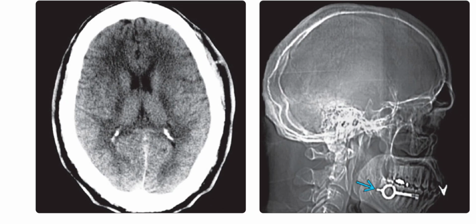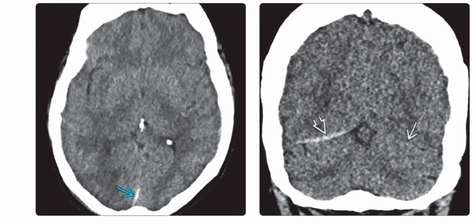This case illustrates the importance of looking at the scout view in every patient, especially those which are being imaged for trauma. Left is the axial non-enhanced CT scan in a 64-year-old female with a ground level fall, and it shows only a small linear hyperdensity adjacent to the falx cerebri and torcular herophili. The scan was initially considered normal. Right is the coronal non-enhanced CT scan in the same patient. It was reformatted from the axial source data. Note thin peritentorial acute subdural hematoma, which is nicely contrasted with the nearly invisible normal left side of the tentorium.